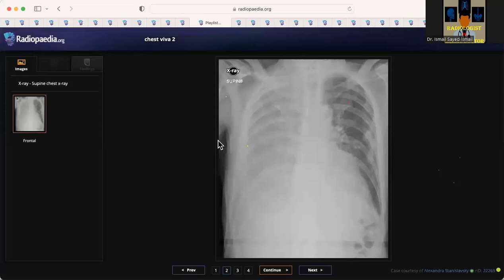So I would like to ask the patient about constitutional symptoms such as fever and search for previous radiographs, or I can have a possibility such as mesothelioma. So I have to look at the pleural border, whether there is mediastinal pleural involvement, and ask the patient about history of asbestos exposure. Also, this is a supine position. It could be effusion, but effusion would usually make a mediastinal shift to the contralateral side.